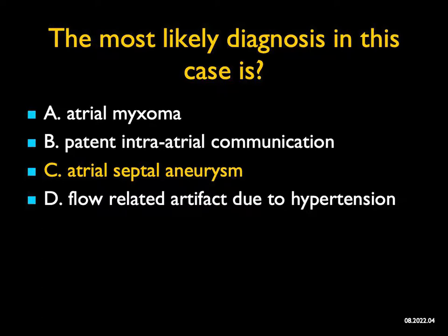If unfilled with opacified blood, then it can mimic an intracardiac mass. It's interesting, it's a rare but well-localized saccular deformity of the atrial septum. Again, it's something we see occasionally on CT, but it's very important to recognize. The initial CT descriptions only were in 2006, so something very important to recognize so you don't confuse it with other pathology.